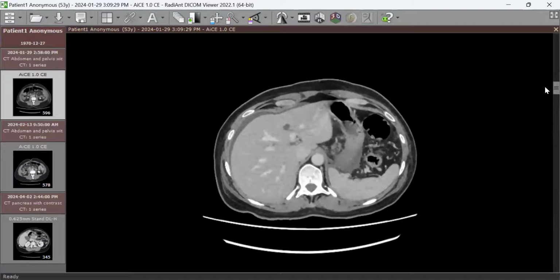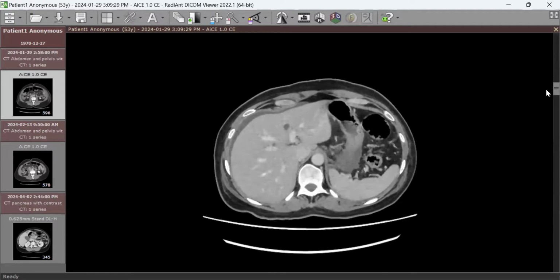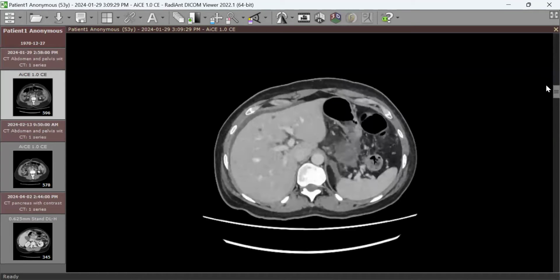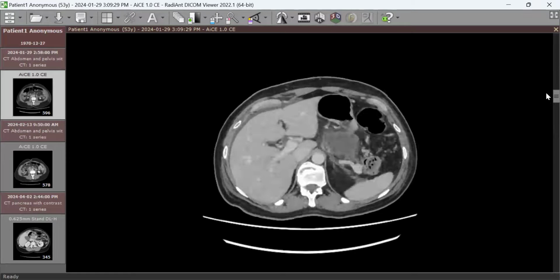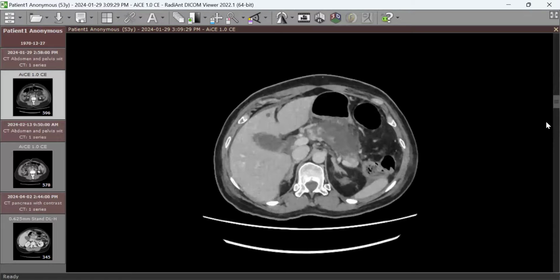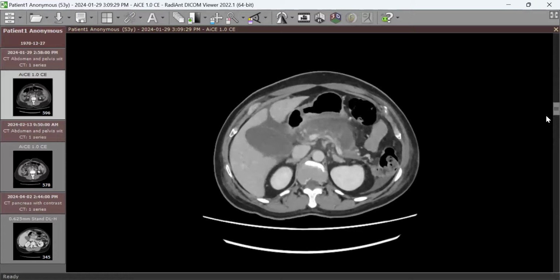Biliary dilatation is on one side of the portal vein. Periportal edema is on the two sides, because we said periportal, it is around the portal vein, both sides. Since we are cutting axially, it is on either side of the vein. But the biliary duct is one duct along the vein going on one side. We follow the anatomy obviously, and we can see that there is mild dilatation. Okay.